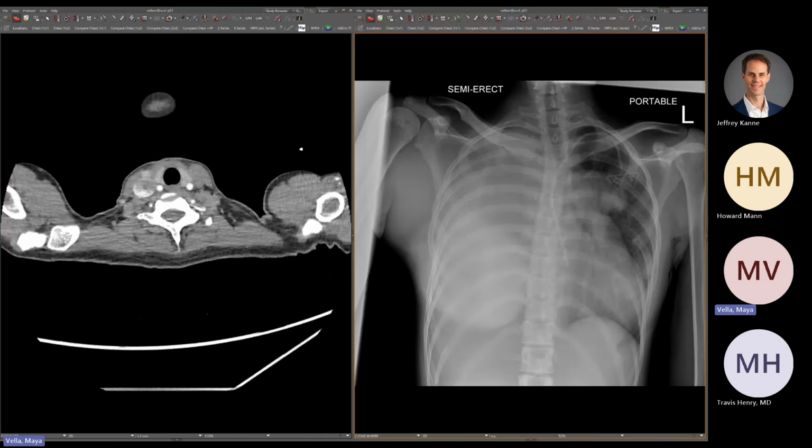So in this radiograph, we obviously have a patient, they've got a port, they've got essentially complete whiteout of their right hemithorax, and we notice that their trachea is pretty significantly deviated, right? The carina is over here at this level, off to the left-hand side of the spine. The heart is being pushed over as well.